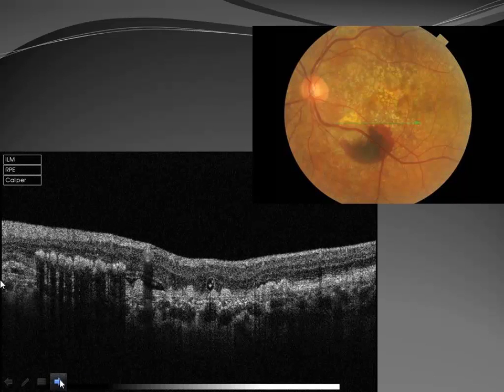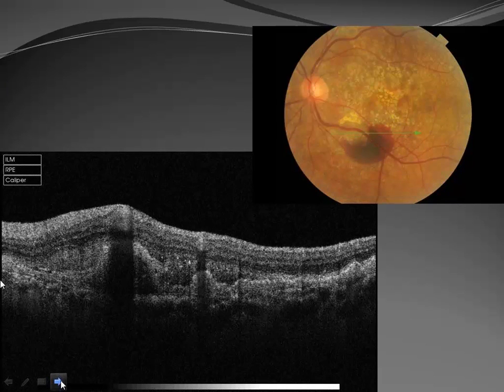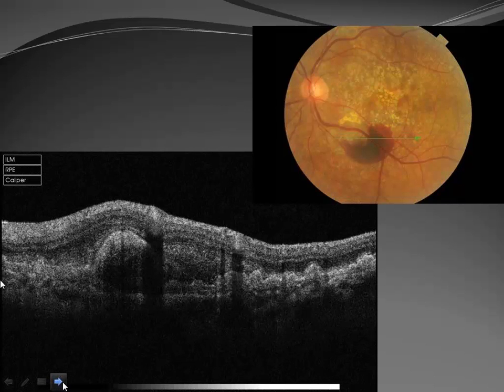So he's being treated with Avastin, which would be typical. You don't really have to prove it with fluorescein. You don't really need a fluorescein. We did it anyway, but it didn't show the choroidal neovascularization under it because there's too much blood. There are too many things. So the patient has a thickened area here below the macula in the arcades, and there's clear fluid, blood here, serosanguinous fluid, if you will, and exudative deposits. All these little white dots are exudates. So we wish this patient well.